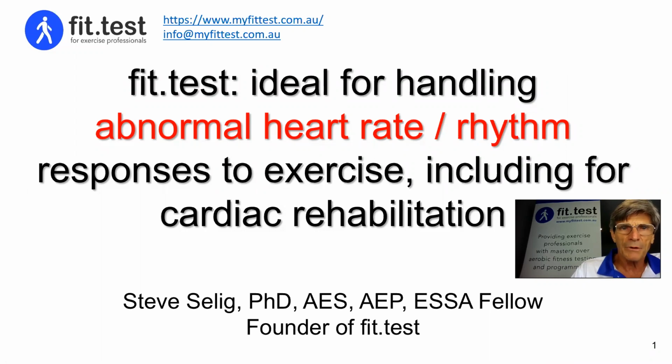In this short video I'm going to show you how fittest is ideal for handling abnormal heart rates or heart rhythms in response to exercise, including in applications for cardiac rehabilitation. One of the most frequent questions I get in relation to using fittest is about this topic: how do you deal with abnormal heart rates in response to exercise? And that can be for anybody, not just for people in cardiac rehabilitation programs. Usually what people are talking about are low heart rates.